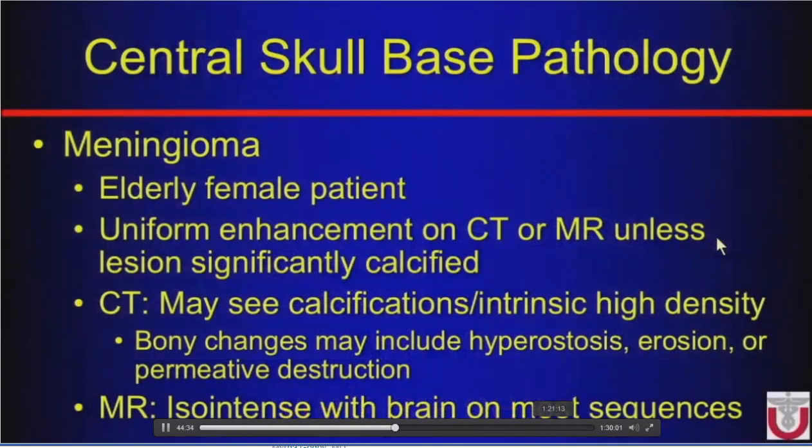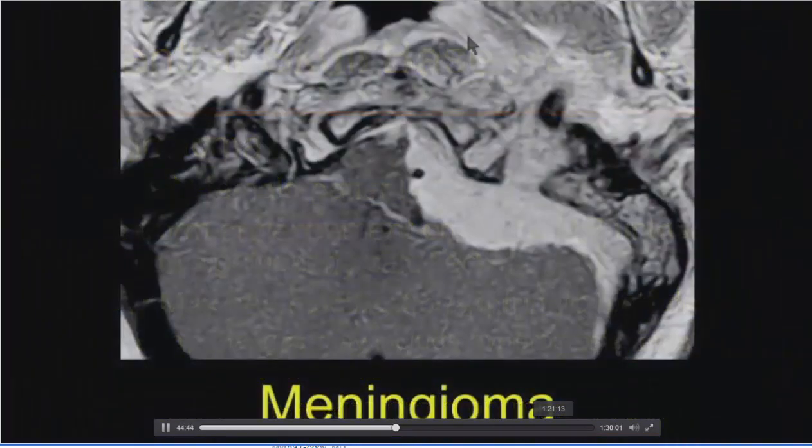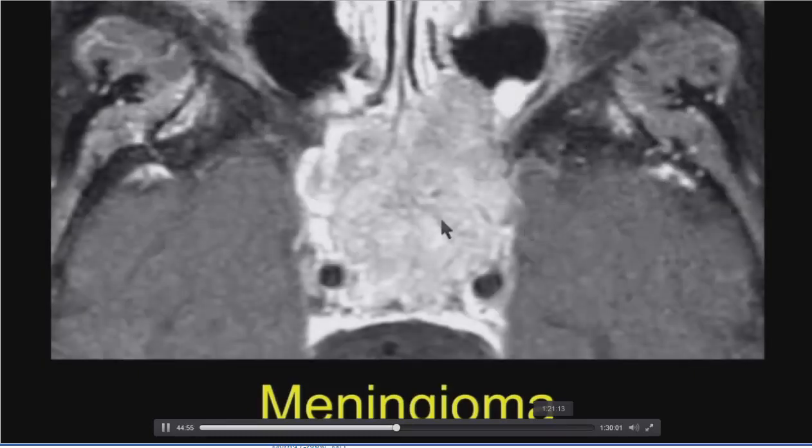Now, meningiomas, as you heard, can have different appearances. Most common extraaxial tumor, usually dural based with dural tails, avid enhancement, but they can be intraosseous. So what we like to see is an extraaxial mass with avid enhancement, dural tails, and a dural base. They extend through all those foramen around the central skull base when they occur there, but we can also see meningiomas within the bone. So again, just like a marrow replacing process, this is going to be a big differential, and it's hard to differentiate sometimes those pathologies. So here we see an avidly enhancing mass of the central skull base of the sphenoid.